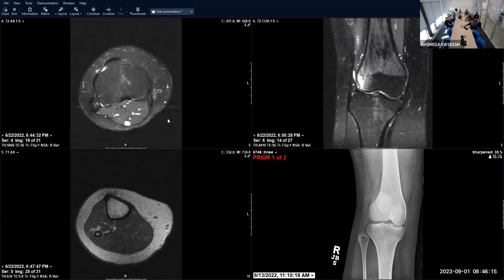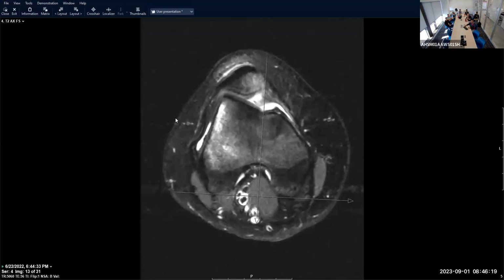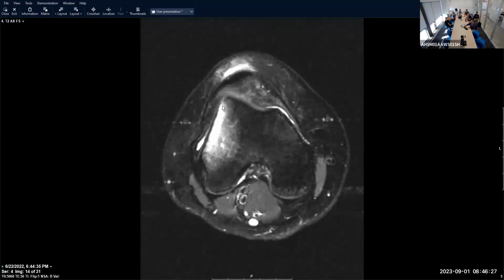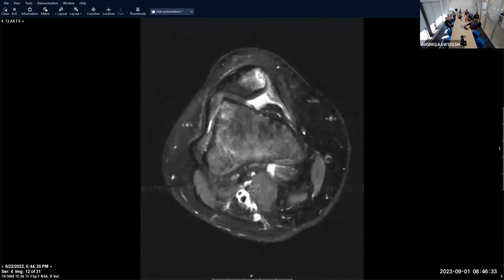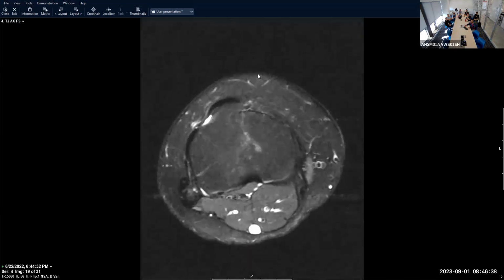Okay, here we go. What's going on here? I'm sure you've seen this. Yeah, transient lateral patellar dislocation, right? So we see marked marrow edema of our lateral femoral condyle and marked marrow edema of our medial patellar facet, indicative of contusions or osteochondral impaction injuries.